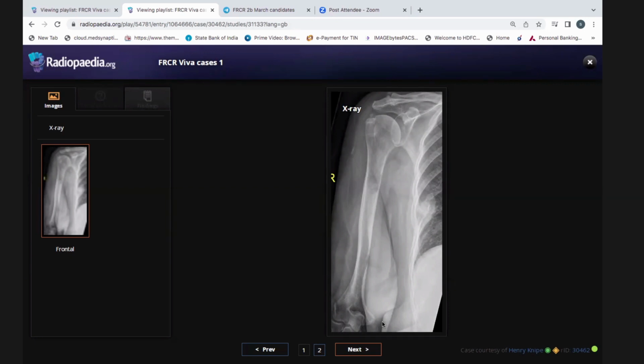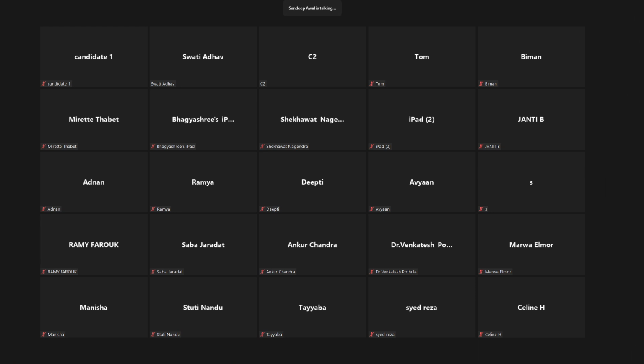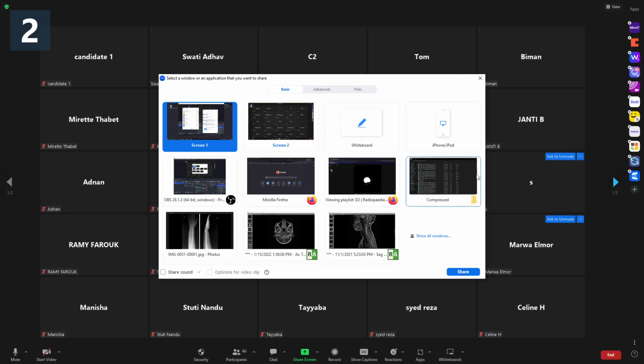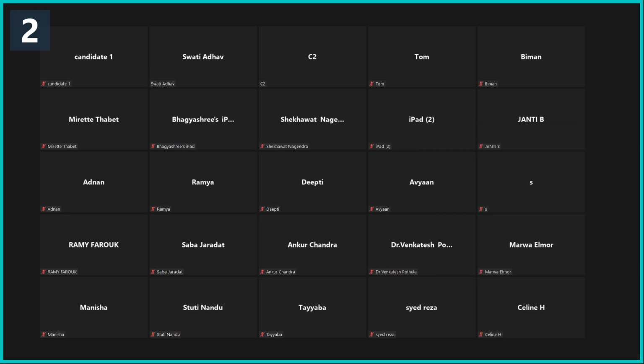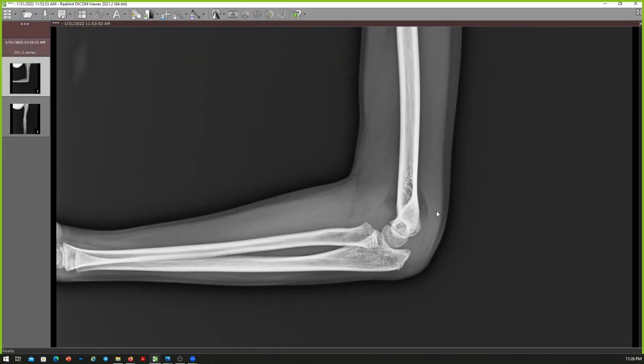And now we have C2. So candidate 2 is named C2. Are you there with us? Yeah, I'm here. So stop sharing. Yes, please, ma'am. So I will start sharing my screen and I will set the timer. Please give me a moment. Yes. So can you see my screen, candidate 2? Yeah, C2, I can see. Can you see an elbow radiograph? Yes. So I'll set the timer. Meanwhile, you can keep looking at it, and then you can start speaking now.